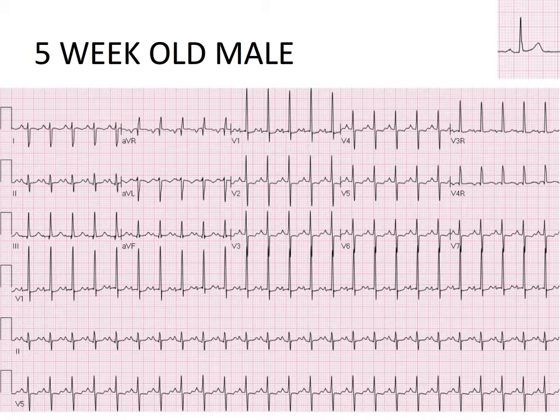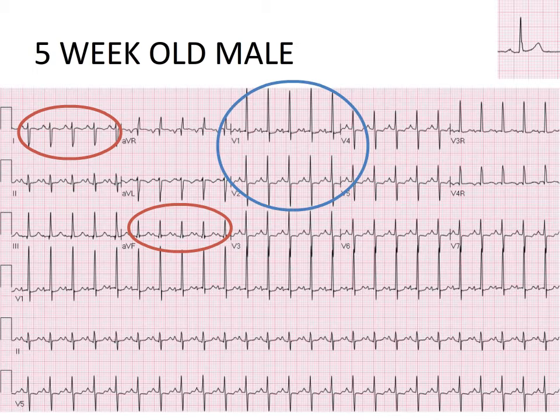Go through this EKG on your own. You should have found that the abnormalities on this EKG are right ventricular hypertrophy and right axis deviation. The right axis deviation is diagnosed because the QRS complexes are down in 1 and up in AVF. You can also see the strong rightward forces in V1 and V2, as well as an upright T wave in V1, which is consistent with RVH.